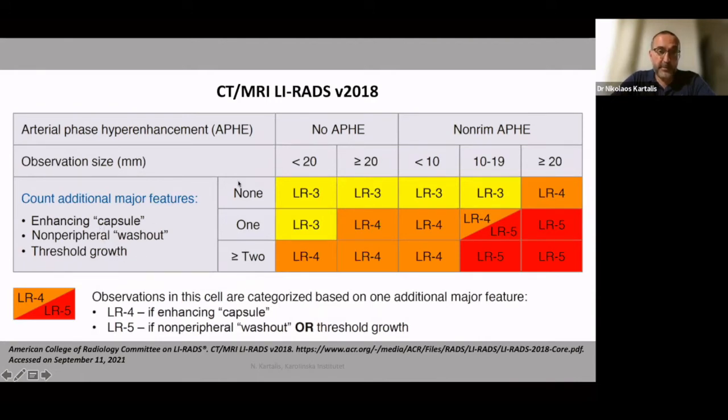So the most important part of the HCC diagnosis is the vascularity of the lesions. That's why these are the major findings.